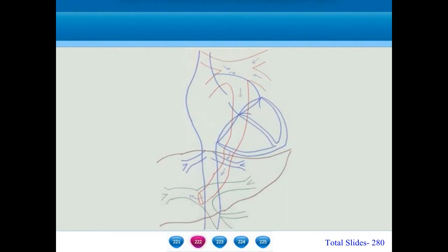If the newborns have a persistence of the patency of ductus venosus, the flow of the pulmonary veins into the portal vein will immediately be decompressed through the ductus venosus into the hepatic veins, thereby facilitating the flow into the right atrium.